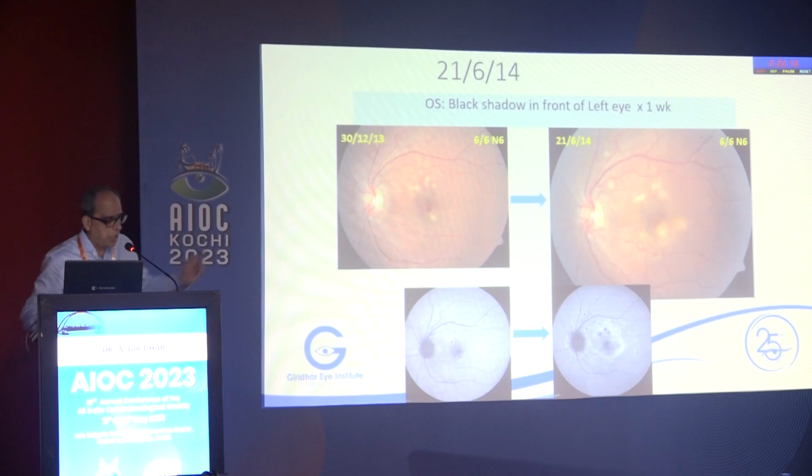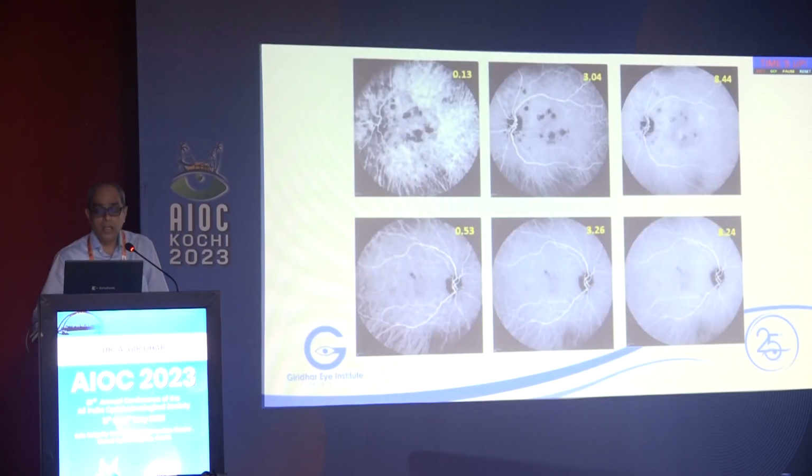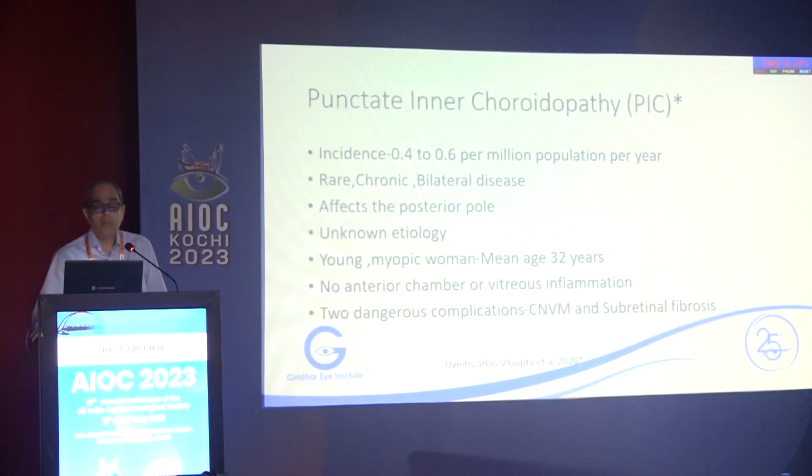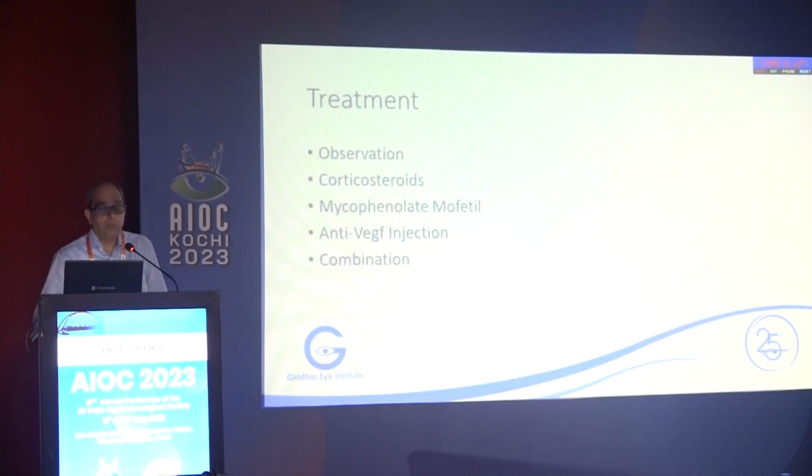Now, if you see the left side, lower autofluorescence, you see patches of decreased autofluorescence surrounded by hyperautofluorescence. So, the presence of hyperautofluorescence, especially in cases like serpiginous choroiditis and all, the PGI group has beautifully demonstrated how increased autofluorescence is a sign of activity. So, in inflammatory disease also, it is a very useful method of application.